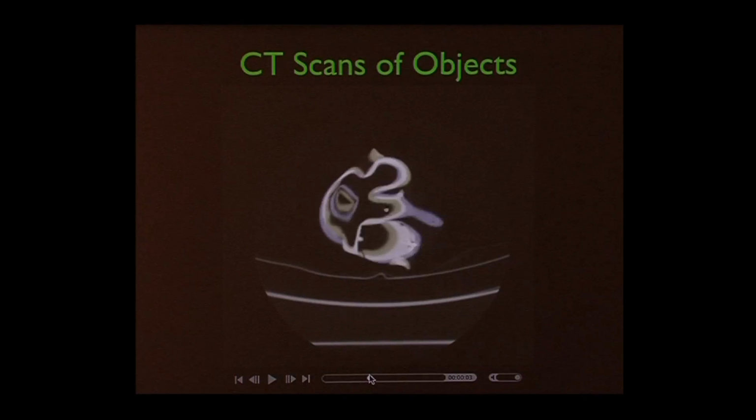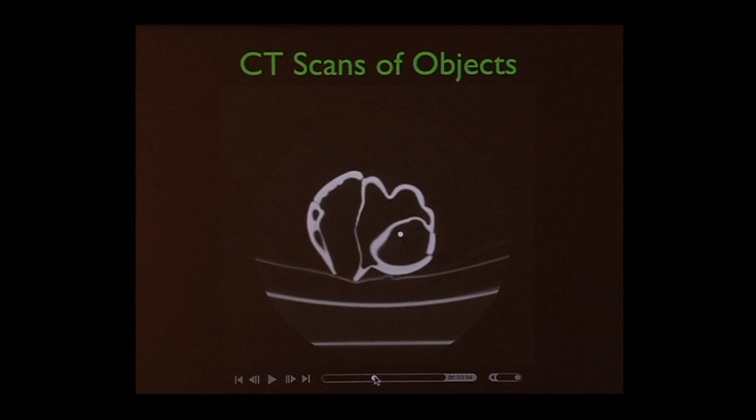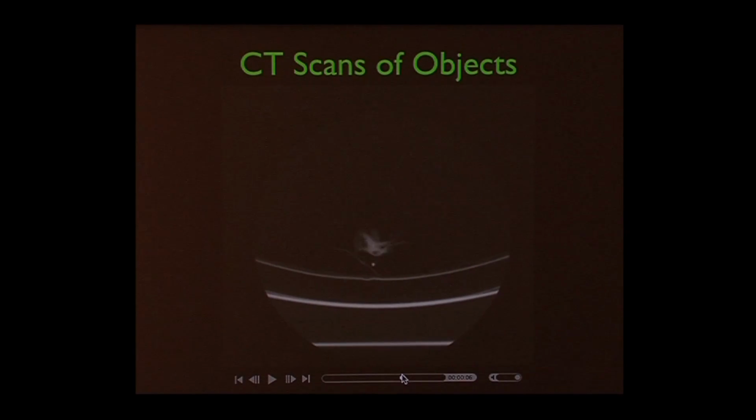Now, if you're a medical student studying anatomy, and this came right out of the Goldberg Center's lab where I taught medical students anatomy, I'm actually a professor of anatomy too, by the way. You probably don't know what this is, and I'm going to show you how easy it is to figure it out in a second. This was a living structure right before I brought it to the lab. It's a flower, and I picked it. It was outside my window, and I thought, that'd be an interesting one to scan. So I brought a flower over there. And you'll never guess this one, I presume, unless you've seen my bookshelf.